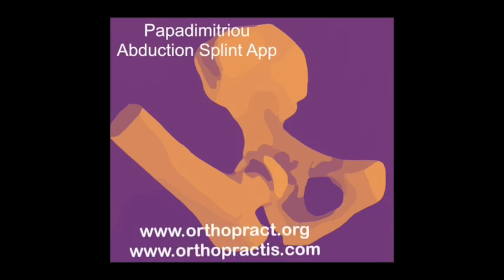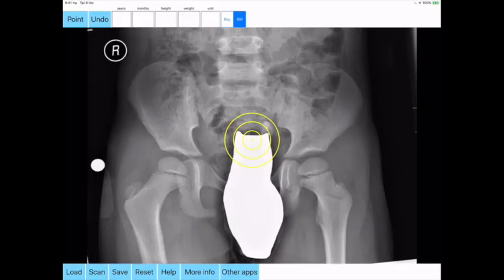How to measure with the Papadimitriou Abduction hip splint app. The first thing is to load one image from your photo library or capture a photo from X-rays photos of a patient. Next you fill in the empty boxes according to the patient's height in cm and weight in kg.